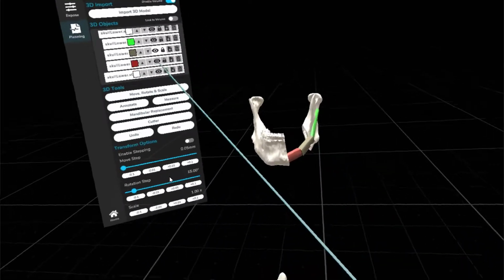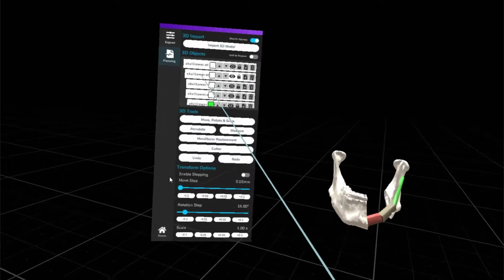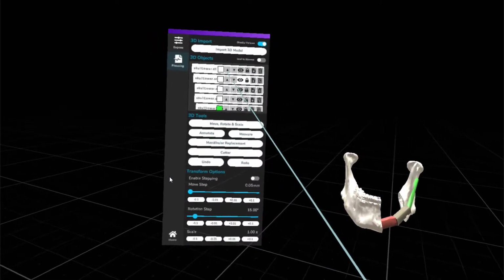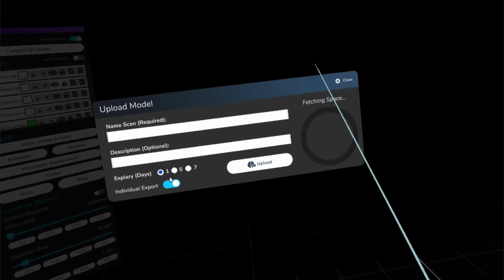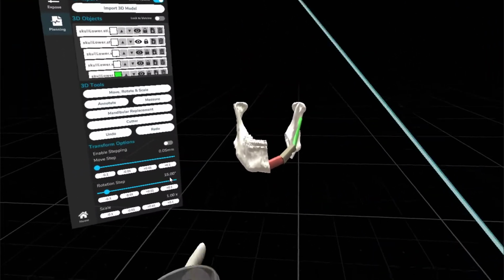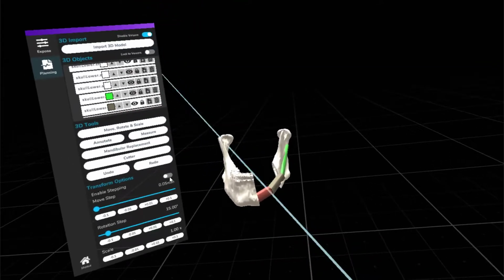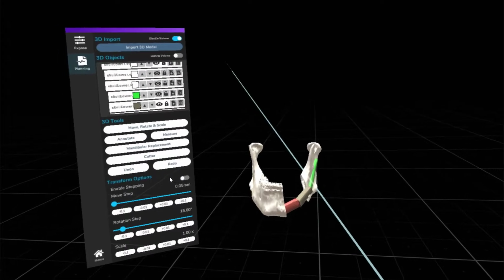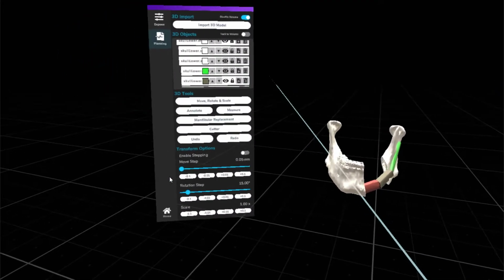And of course, because it's a normal model in the scene as well, we can actually just go ahead and, if you really want to, just upload the whole model directly to your account on FTP, and just essentially send it to a desktop platform. So you can go ahead on desktop platform and load the model, or you can just upload individual bones. You can basically upload any aspect of it and go ahead and either print or visualize the STL files in however means you want to.